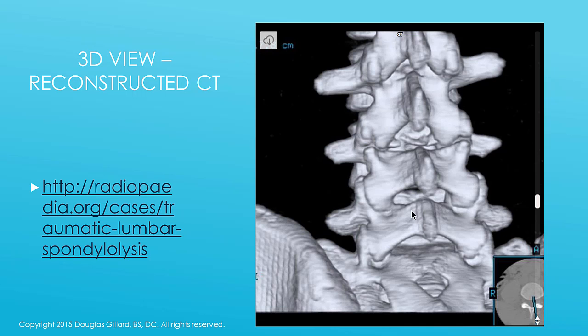Okay. Now what are we doing here? Oh, you can go to this site if you want. I won't do it because it'll mess up things, but Radiopaedia, you can actually see a CT scan of that same view we're looking at, right? So what's that? Spinous process, laminas would be right here. Articular processes would be over here, called the articular pillar. The superior articular process and the inferior articular process collectively are called the articular pillar. And you can see the transverse processes.